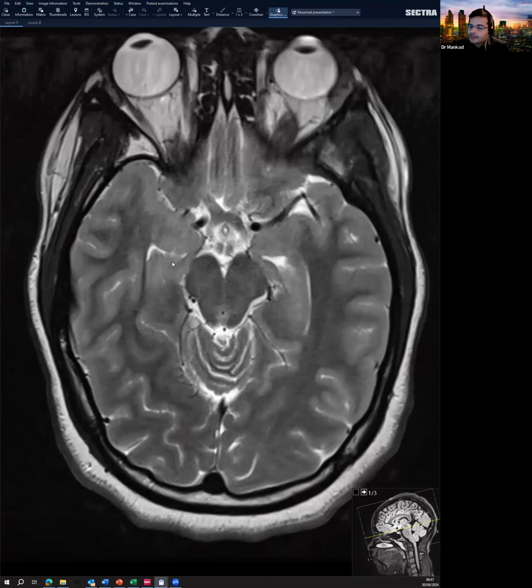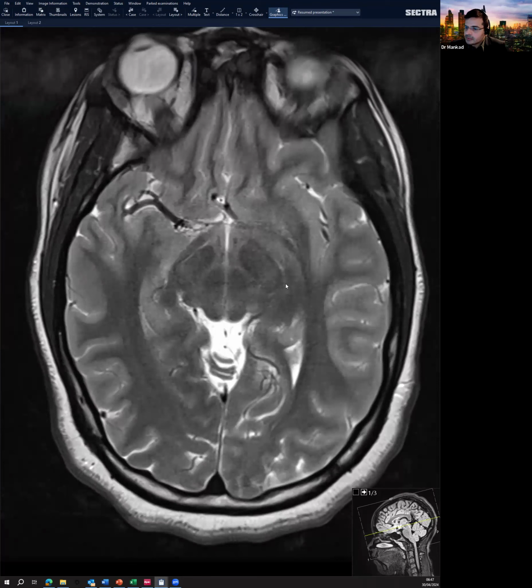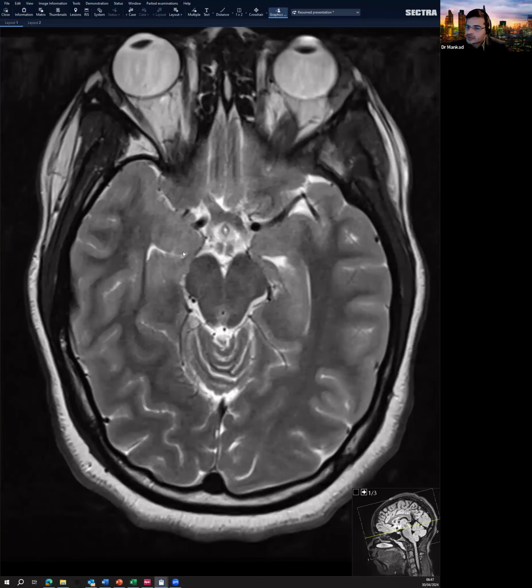The hippocampus has a head, a body, and a tail, and it hugs the midbrain and the brainstem structures around it. That is why they're referred to as the seahorse, if you look at their arrangement looking at each other. So the left hippocampal amygdala formation and the right side.